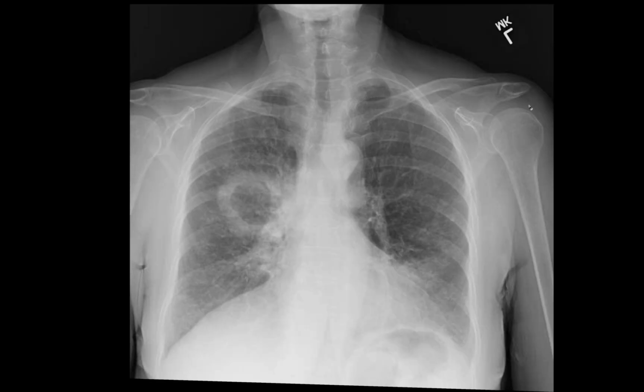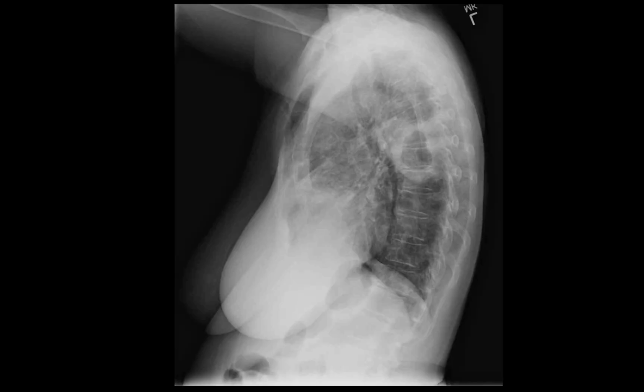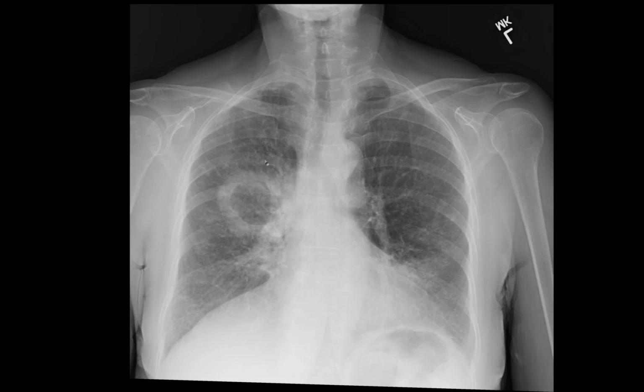So I saw this radiograph in May, one with a big cavity with a fluid level in the bottom of it. On lateral view, you can see it's sitting back there, probably in the superior segment of the right lower lobe. The lungs are not normal elsewhere. There seem to be thickened bronchi going up here and little dots and maybe bronchial wall thickening in the left mid lung and base too.